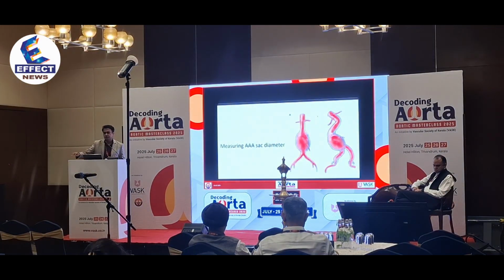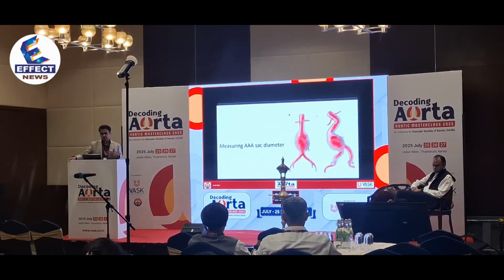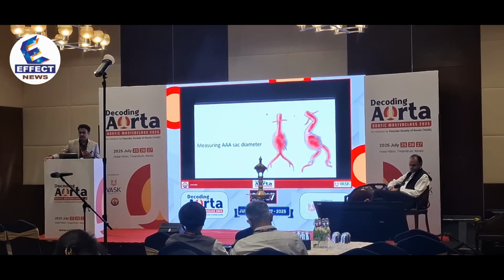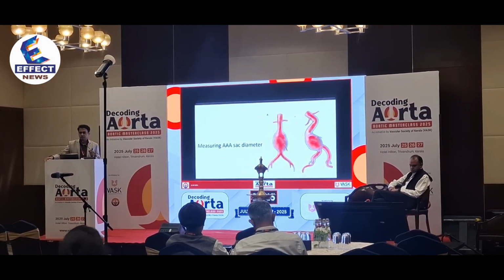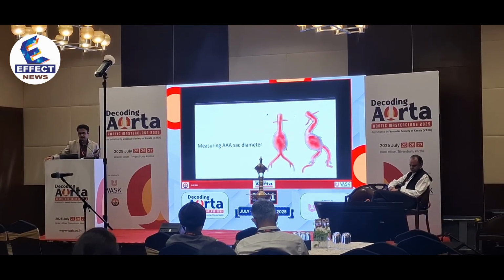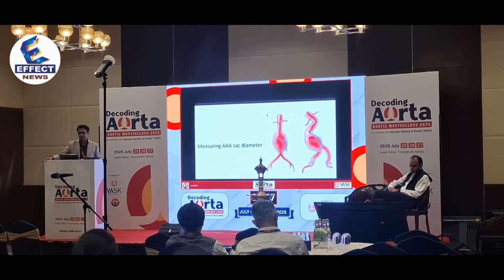The next thing you ought to do is take a measurement, because you want to confirm whether you are doing the procedure for the right indication. A fallacy in this step is, if you notice, most aneurysms as they grow, they tend to bend or deviate. The reason being, they have to now accommodate in that previously restricted space.